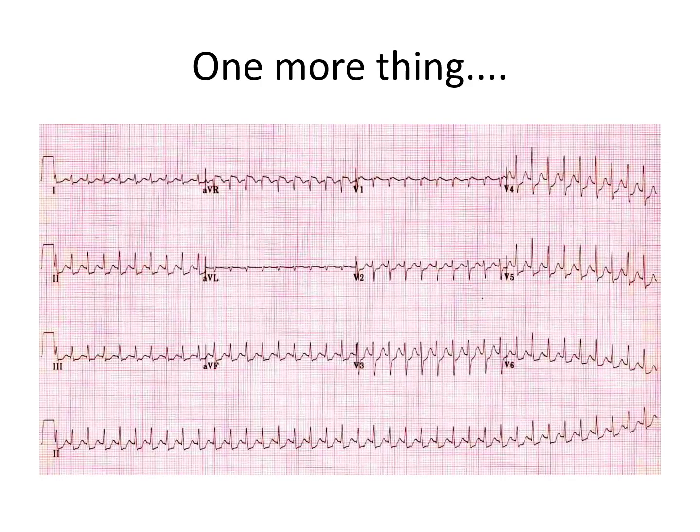And also, just a little note, if you have somebody who is in a tachyarrhythmia of some kind, so an SVT or AFib or a flutter, feel free to ignore the ST depressions. They're usually because of the rate. The QRSs are spaced so closely together, it doesn't allow the ST segment to go back to normal. So the appropriate thing to do is to slow them down and then see how the ST segment looks, rather than assume that there is ischemia right off the bat.